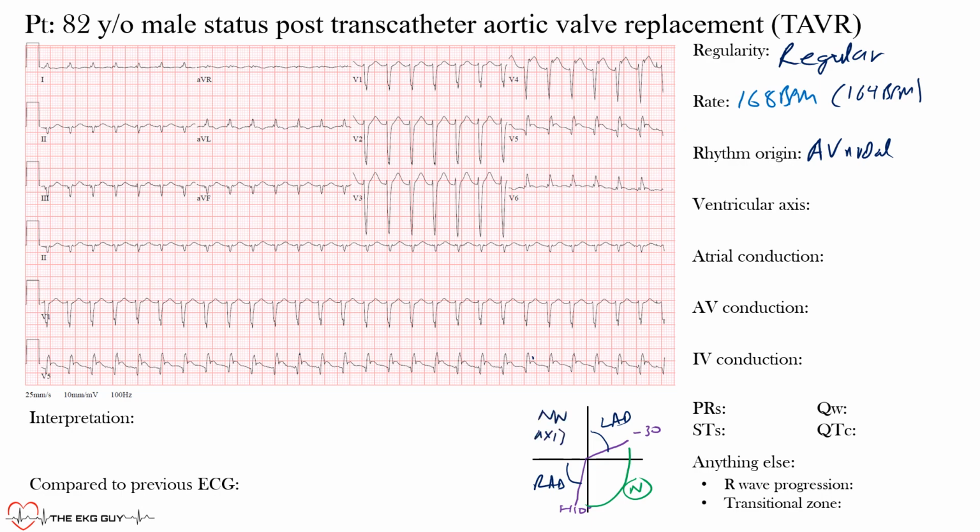Why do we call it that? Well, this is north, this is west, so you can imagine this area here is that northwest. All right, not too many things occur there. Ventricular tachycardia can occur there, and is something that is helpful in making that diagnosis. So what we have here is we have to find the axis. We know that lead 1 sits here, okay, the positive end, and lead AVF sits here, all right, at positive 90 degrees. So let's just redraw that here.